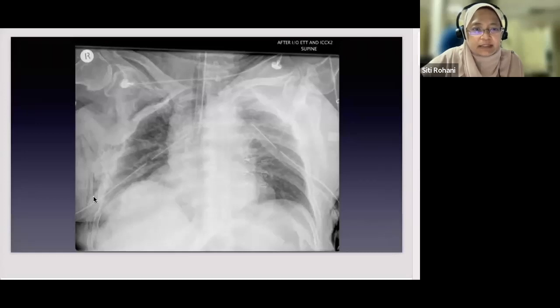Okay, there's a bilateral chest tube insertion. There's evidence of emphysema. When we see emphysema, we need to determine whether there are multiple rib fractures. There are multiple rib fractures on the right side of this patient. So the ECG lines, tubes, and lines can also obscure part of the X-rays. So determination of the lines and tube position is very important.